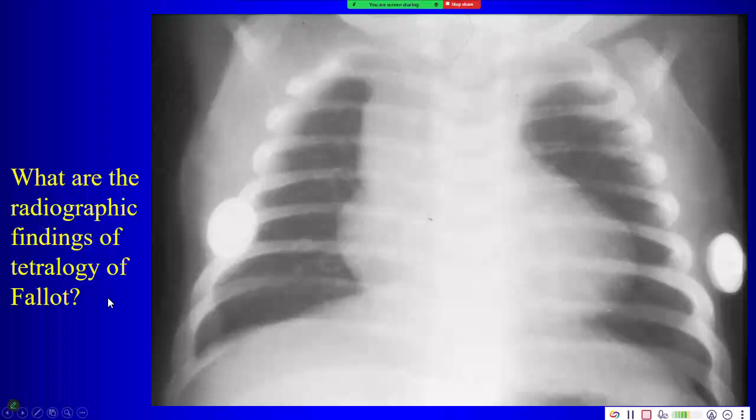Now, the radiographic manifestations of tetralogy of Fallot. So what are the radiographic manifestations? Who wants to tell us?